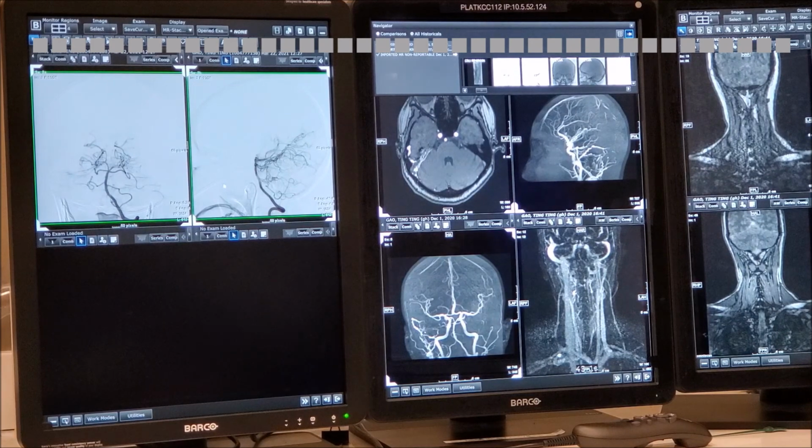Okay, so the middle meningeal artery, ascending pharyngeal artery, occipital artery. What meningeal branch comes from the occipital? Posterior meningeal? No, the so-called posterior meningeal comes from the vert; the transmastoid, and we're going to go over it in a second. Okay, so the occipital with the transmastoid.